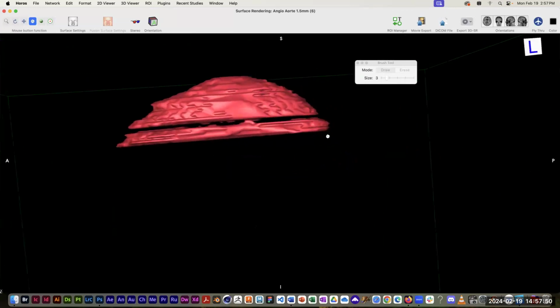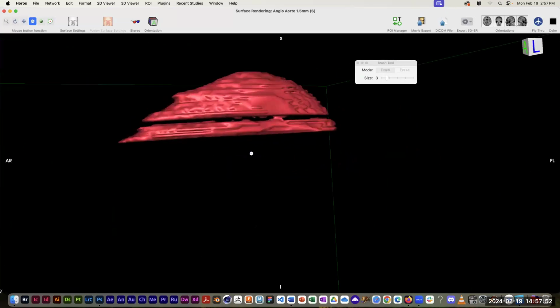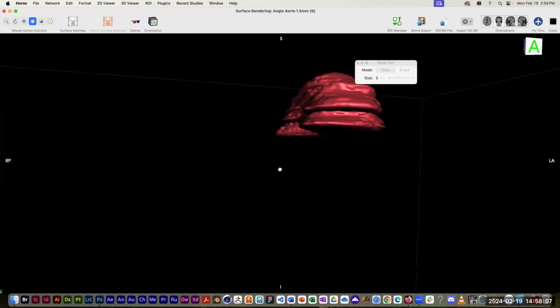Although not sure why it would do that, because if you select all of the regions of interest and color the interior white, it should have colored them all. Even if I had 17 ROIs all on one layer, I'm selecting them all, applying it to all the ROIs, so it should have worked. But yeah, all that for this.